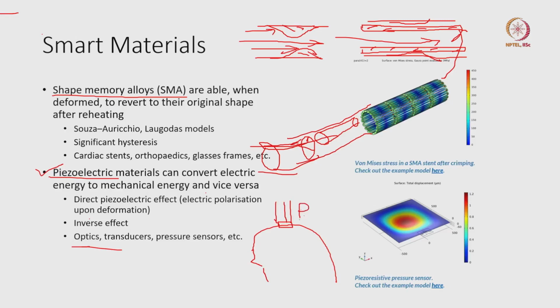So, how do you do that? One of the ways is to use a diaphragm that you see over here. This diaphragm could be a part of the probe, and this diaphragm is going to give the force on this probe tip.